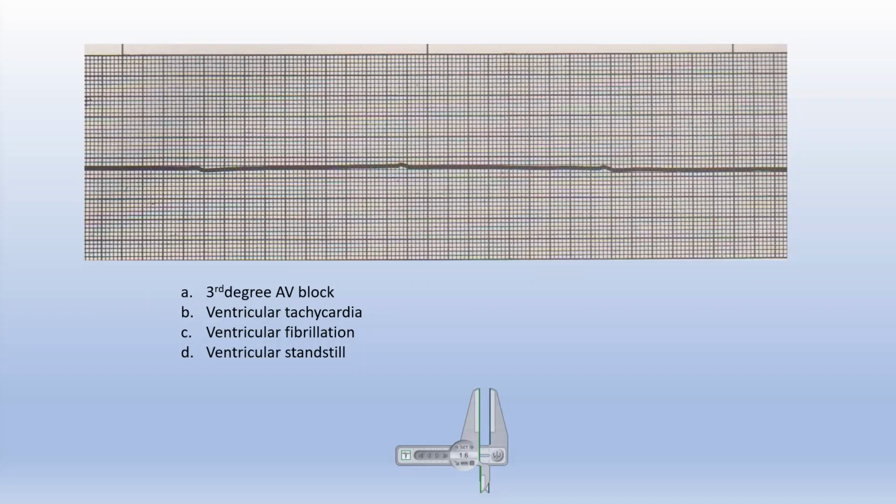So we always have to assess the patient. If it is the patient, in fact, and we have established by checking all the leads, we're going to therefore perform CPR. And what is the other intervention for ventricular standstill other than CPR? Epinephrine. And those are the only two interventions known to man for this particular rhythm at this point. Okay? All right, let's go to the next one.